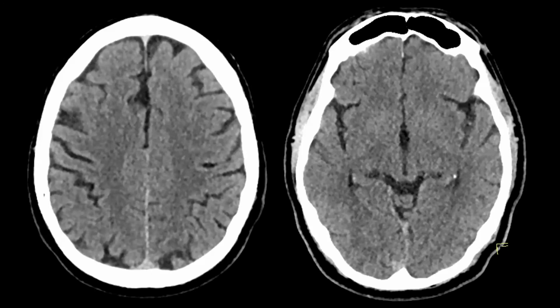There are a lot of sulci in the brain, and there is a separate video on this channel discussing cerebral cortex anatomy, in which the anatomy of the cerebral gyri and sulci is discussed in great detail. Definitely check it out. It's less than an hour long, but needless to say, I won't discuss cerebral sulcal and cortical anatomy in detail in this video.